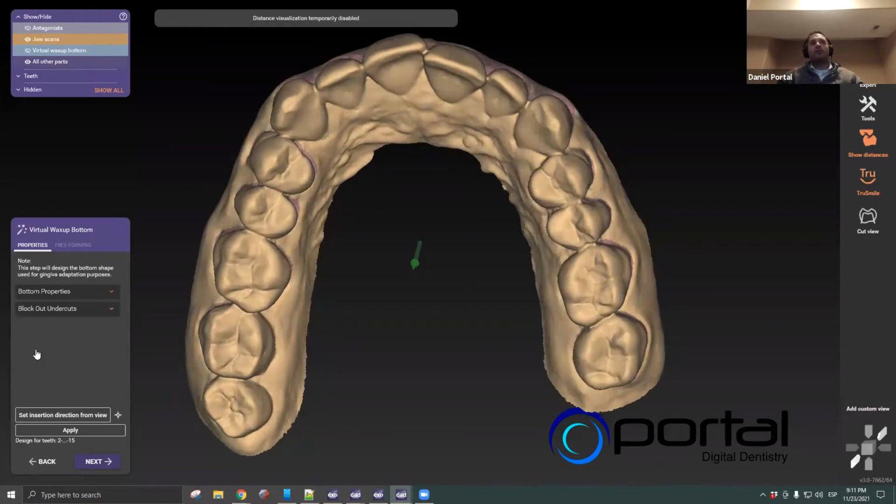And what I'm going to do is, obviously I already understand the steps that are being proposed, but if we read the instructions there, we'll be able to get through each one of the steps, no problem. And so I'll just speed through this initial part and get to the point where we start seeing some of the tools that exocad has launched with this new version of the software.